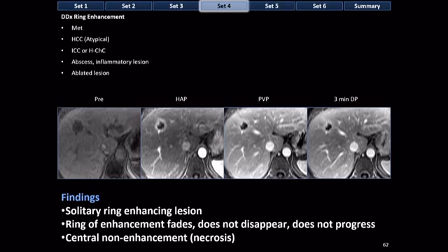Now, I mentioned earlier that elderly men will sometimes get HCCs for no good reason, but middle-aged women don't tend to get HCCs for no good reason. This thing is not obstructing any bile ducts, not causing any capsular retraction, so I don't really like it for ICC. So what could this be? Well, my mentor, Bob Matry, looked at this case in my first year as an attending, 2001, and he said, this patient has cancer in the liver. This is a metastasis from outside the liver.